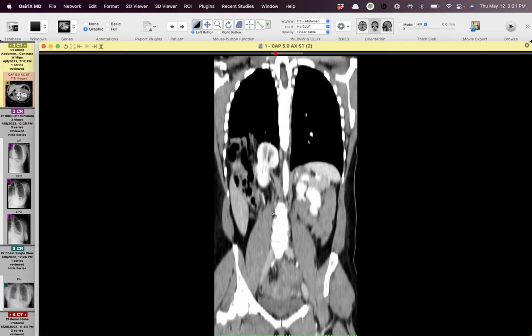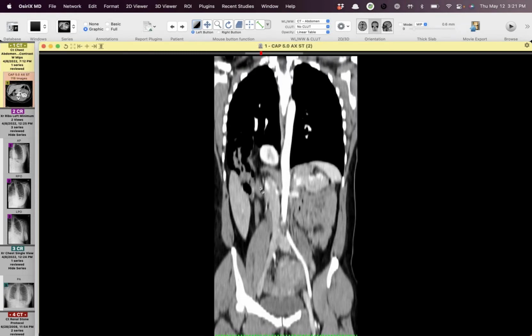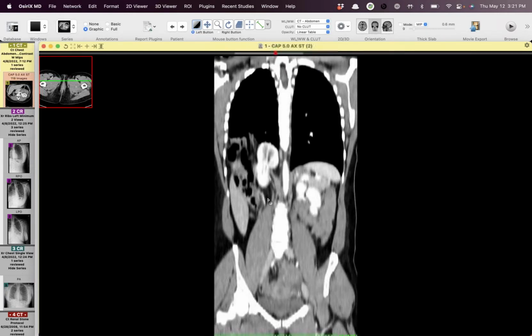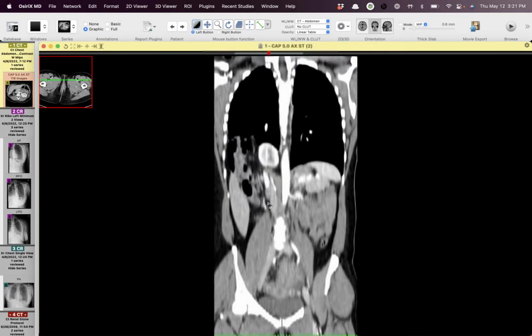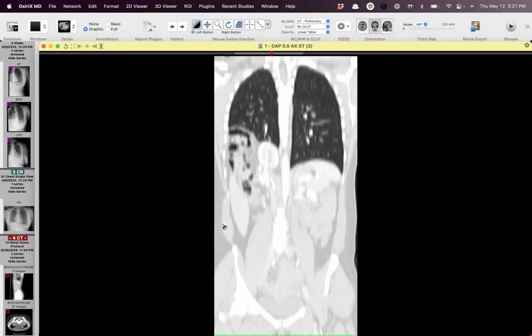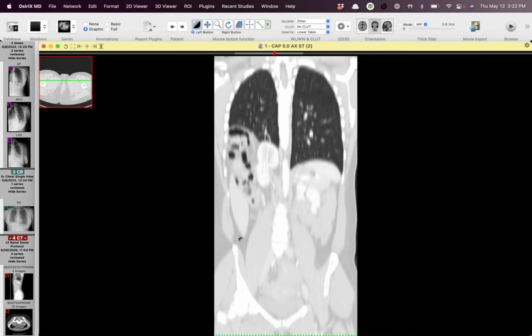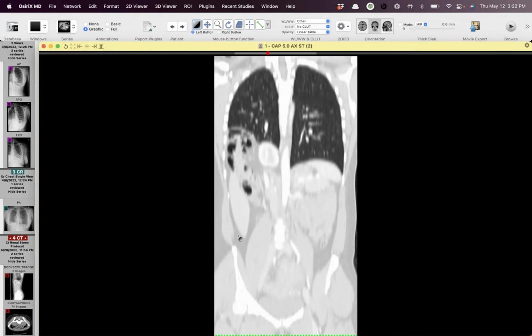Yeah, I wish I had thinner slices, but this got done elsewhere. There's definitely, and I think it is too lateral to be just the Bochdalek. Right. So I think if there's a nice smooth covering over the top, then maybe it's a weird eventration, although it's pretty far lateral. Bob, could you lighten the window here, get us less contrast? Yeah. I think it's probably a weird hernia, and it looks as if it's larger on that 14-year previous study.